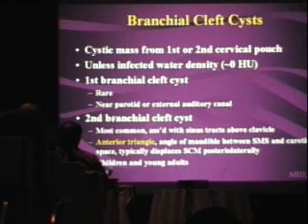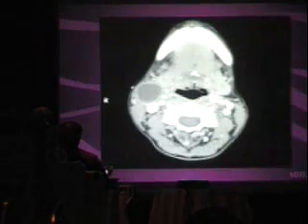They're the type of thing that some people build their academic careers on and become full professors debating whether they're really in the external auditory canal or part of the parotid gland. The bottom line is it really doesn't matter. If you see a simple unilocular cyst at about that level, that's probably a first branchial cleft cyst, but it's the second ones that are really much more common.